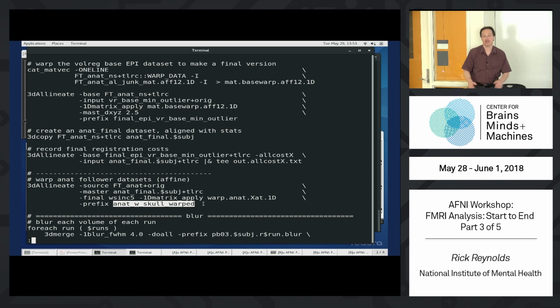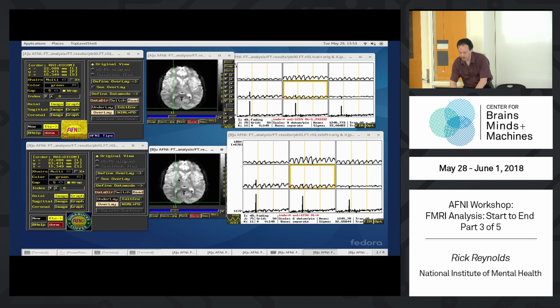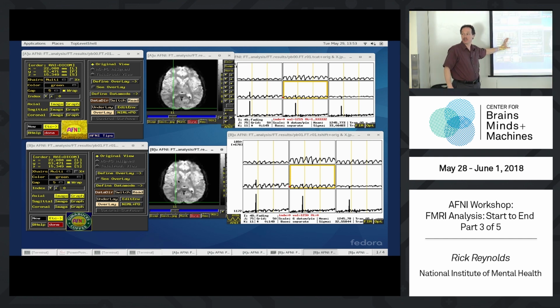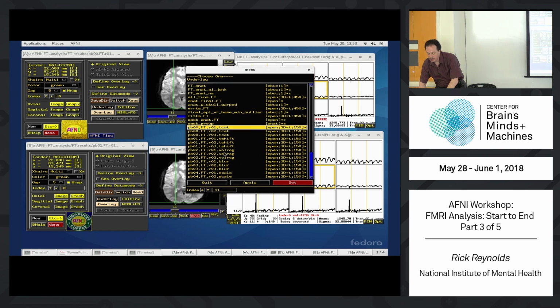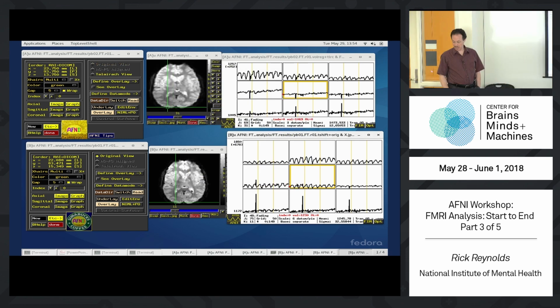So let's look at this. Let's leap back to AFNI. I'll minimize my terminals. Now controller A was the original TCAT, controller B was the T-shift, and then we went into registration. So let's change controller A now to be in standard space. On top, controller A, I'm going to switch underlay to be the Volreg output, pb02.ft.run1.volreg. And what do we notice here?